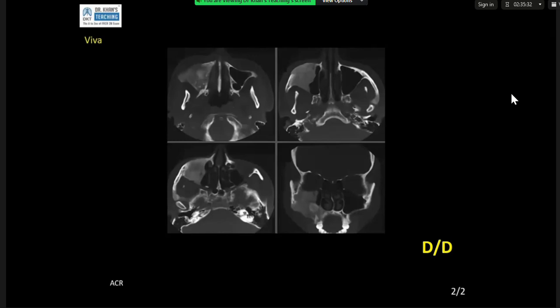The other possibility, if there was no abscess, is bony proliferation. The appearance is ground glass and heterogeneous. In a young patient, we think of fibrous dysplasia as the top differential.